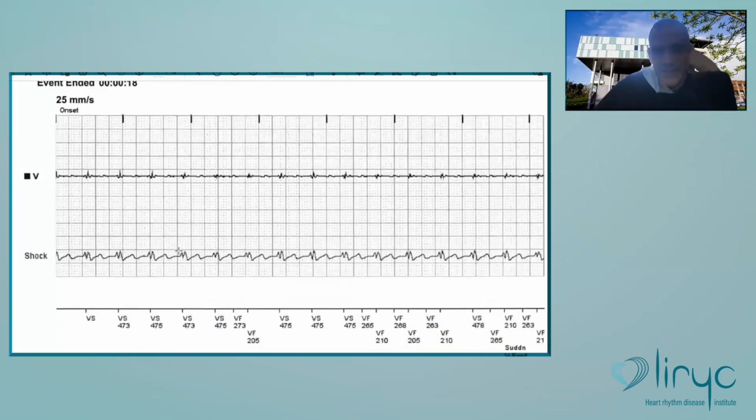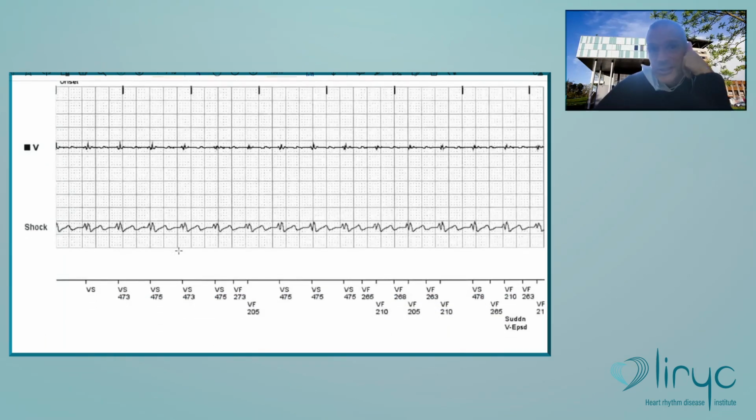So once more, I show you this tracing, just to say that it is so infrequent that you will probably never see any problem of T-wave oversensing in a patient with a Boston device. For sure, with a subcutaneous ICD, Boston has a lot of problems of T-wave oversensing, but not with their traditional endovenous ICDs.